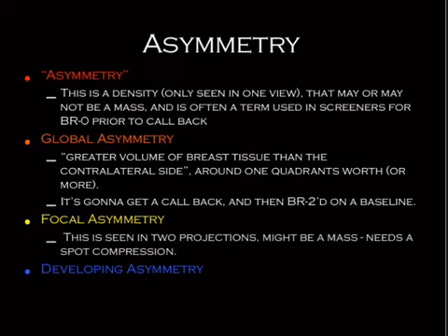A focal asymmetry is a lesion that is seen on two views, but you haven't interrogated it completely to describe it using the right vocabulary words, because you haven't got a spot compression or magnification views and those kinds of things.